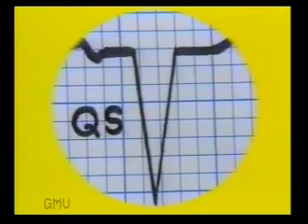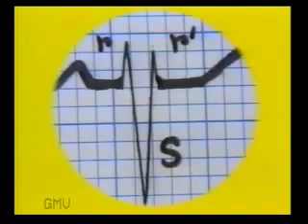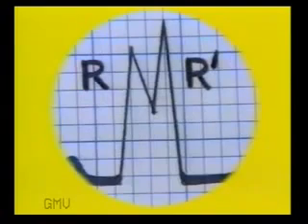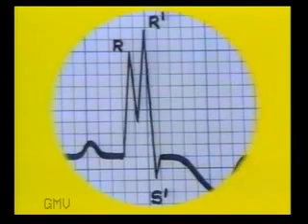complex. And in this complex there is only a downward deflection, no R wave. We do not know whether it is a Q wave or an S wave, so it is termed as QS complex. This is an RSR dash with a deep S wave. This is an RSR dash with a tall R dash wave. This is an RR dash pattern, and this is an RR dash S dash pattern.